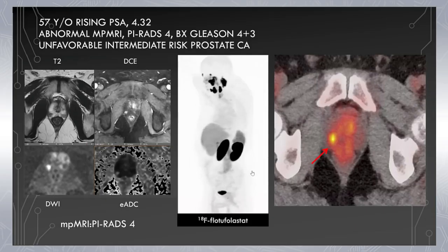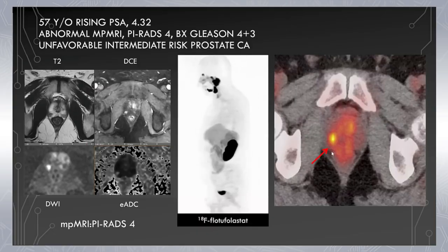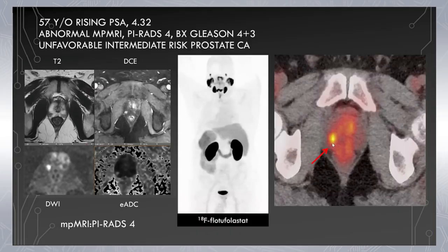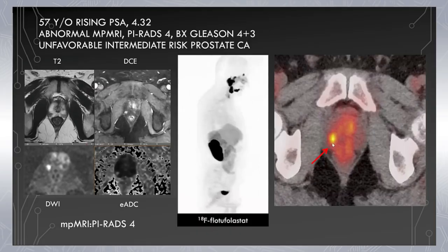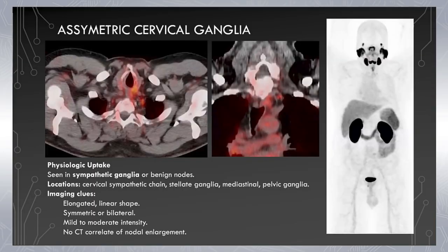Let's look at this patient's PET. The only focus of disease is a subtle one, but we see it clearly within the prostate correlating with this patient's disease. This is the time of diagnosis. And here it is on the axial images, with the fused image. We see the focus of intense radiotracer uptake within the right peripheral zone, and this correlates beautifully with the MRI appearance. So let's look at this patient's coronal MIP image. Again, we see the focus of abnormal uptake within the right peripheral zone correlating with the patient's sampled neoplasm.